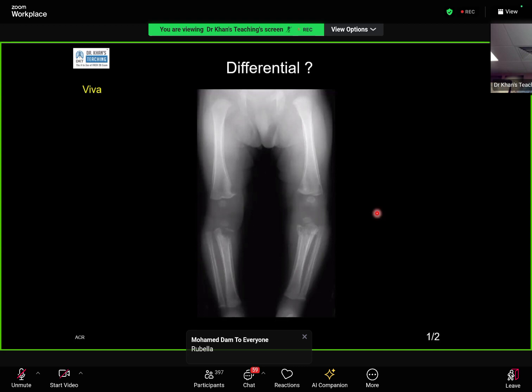This medial pointing of the distal femoral metaphysis could represent Pelkan spur, and there's relative lucency just at the metaphysis, which could represent the Trümmerfeld zone. So yes, these findings represent features of scurvy. So what is Wimberger sign? Wimberger ring sign is when the epiphysis shows a sclerotic rim around it. Okay, so I'll take over.